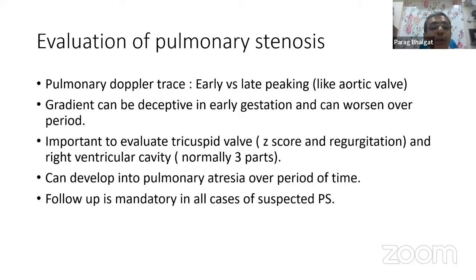Again, pulse wave Doppler or Doppler trace show early or late peaking like aortic stenosis. Gradient can be deceptive in early gestation. It is important to evaluate tricuspid valve Z score and right ventricular cavity.